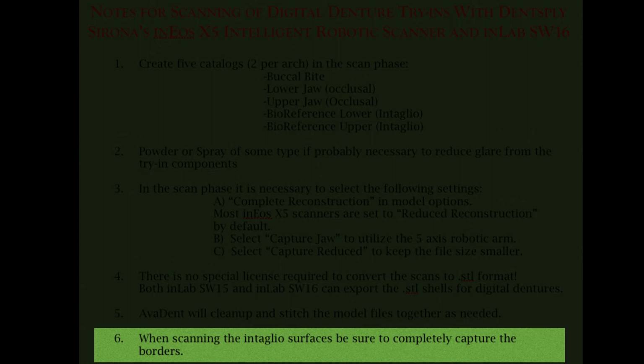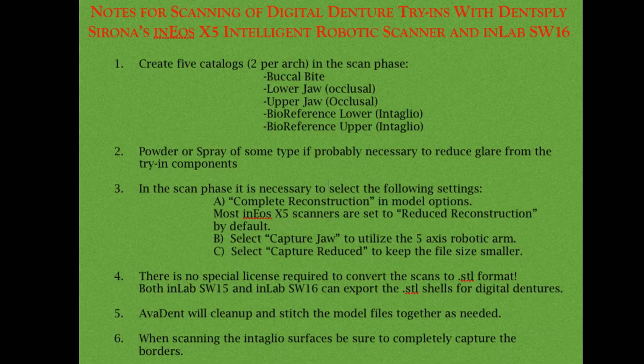6, when scanning the intaglio surface, be sure to completely capture the borders. Again, if you don't capture the borders, the denture is not going to fit well. You'll have an unhappy patient and an unhappy doctor.